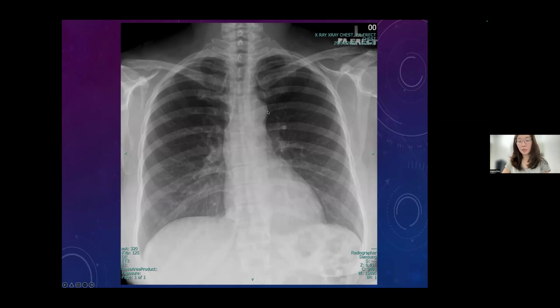So again, the reminder from this X-ray will be the review areas. Look at the opacity, bilateral, symmetrical, costophrenic angle, the next apical region. Once you scrutinize this region, both sides must compare, then you will find the abnormalities, okay? After the apical region, remember will be the mediastinum. Paratracheal region first, and then mediastinum, then hilum, make sure it's symmetrical and there's no nodular opacity here. Then coming down to the cardiac silhouette, and then next will be the retrocardiac region at the back of the heart shadow, and also adjacent to the right heart border, and then going to the paraspinal region. Then next will be the bones, one by one looking. This all will be our normal daily review area.